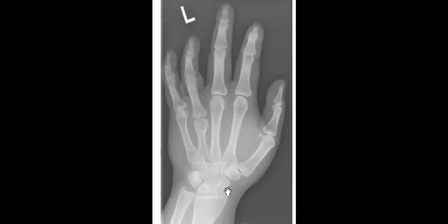Pseudo hyperpara will be top of your list, especially for the exam. If this patient, it's a spot for the pseudo hyperparathyroid. Yes, hypo, it's a spot. Sorry, yeah. Pseudo hypopara, yes, it is not hyper. Sorry. Hypo, yes, hypopara. And you will search for intracranial calcifications.